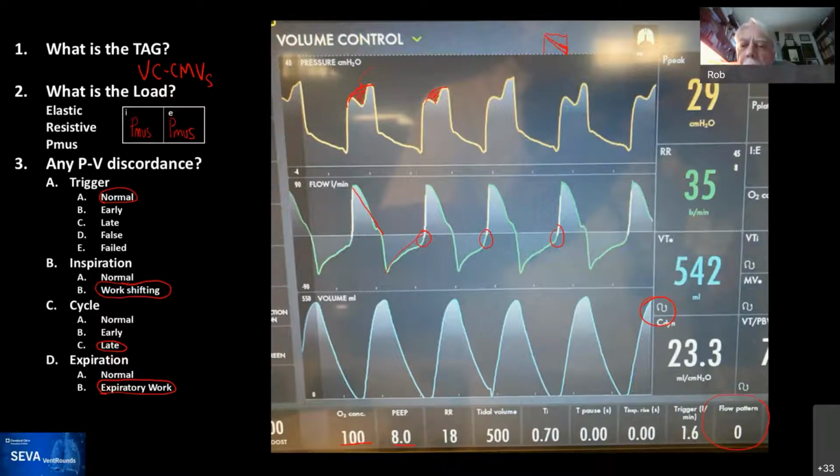So I think what people are seeing, if I can read that correctly, is exhaled tidal volume 540. That's because you can't see the inhaled tidal volume, it's cut off. So let's assume that the inhaled tidal volume was 500. How are you going to get 540 for an exhaled tidal volume? Well, the answer is, again, what we were discussing. This patient is actively exhaling. He's not necessarily going to exhale exactly as much as he inhaled, which means that his FRC is changing every single breath.